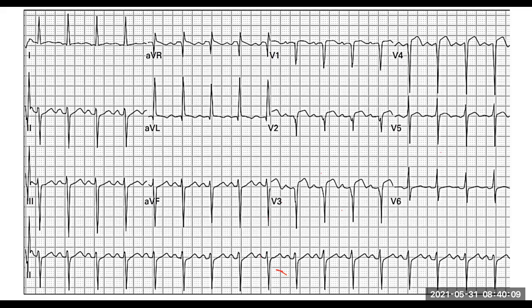What can you use that's sitting in your emergency department that could help you to look at the heart? Very good. Yeah, you could do an ultrasound now to see it. Okay. So a quick scan, even somebody who's not very good at ultrasound could immediately see it. Listen, there's something going wrong with this heart, because there's one part of it that's just popping out like a balloon, or is in an odd shape or something like that. And then immediately you'll say, listen, there's something going on. And it could actually help you to decide, am I really going to send this patient now to cardiothoracics, or am I sending this patient to the physicians? Okay, so those are the things that you can use.